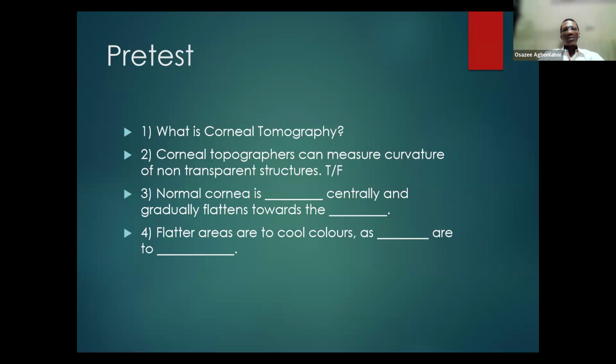All the tomographs don't give their information in 3D view. 3D view means you are looking at it having some form of depth, having some angles towards it. For OCT, I've seen a corneal tomograph and a retinal tomograph in 3D view, and that makes a lot of sense. But the usual ones we have on our retinal map printouts are all in 2D. They're flat.